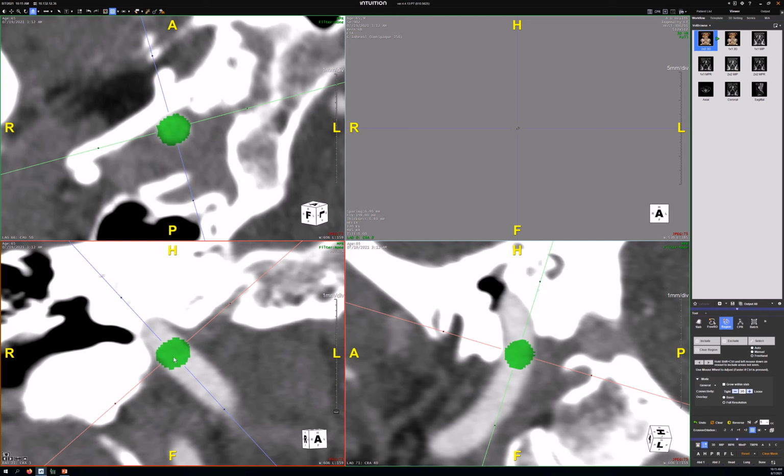Before I make another circle, so that I don't miss any voxels, I go halfway from the center to the periphery. This is painstaking. This is why we're trying to train a machine to do it. Between the center and periphery. Just hold down Alt and click there.